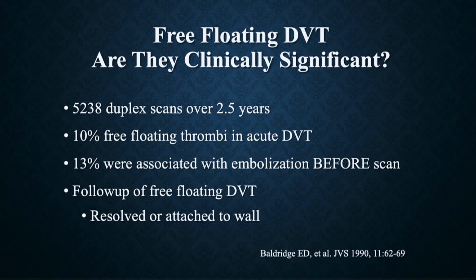When they follow up patients that have had free-floating DVT identified on these scans, they found that either it's resolved or that it becomes attached to the wall. In other words, it becomes a chronic venous change or scarring.